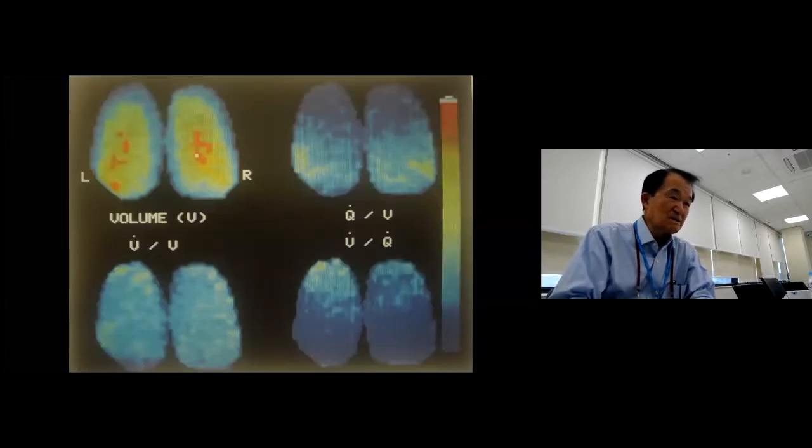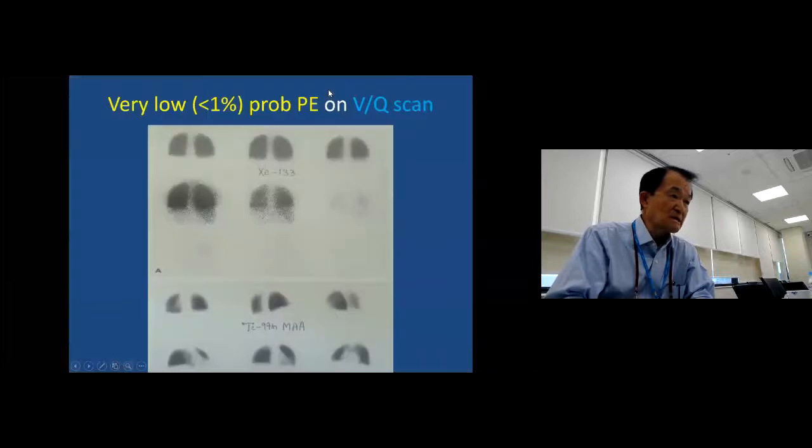Now, as you know, the lower lobe is bigger than the upper, so there is more ventilation and more perfusion in the lower lobe. But the ratio is higher in the apex, the other way around. It's a xenon study, in and out, washed out, uniform activity, breathe in, out, gone.